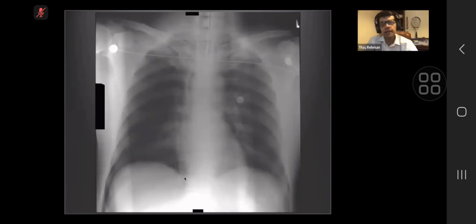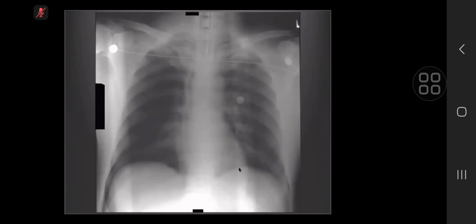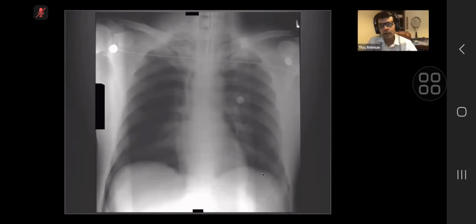So pneumothorax in supine projection, deep sulcus sign. There is another useful sign associated with the deep sulcus sign in supine pneumothorax, which is that the superior margin of the involved diaphragm will be quite pristine and sharp. Can you see that? Yes. It is outlined just by air and not by air inside the lung. Compared to the slightly fuzzy left hemidiaphragm, the right is quite sharp and clear. So deep sulcus sign and a sharp margin of the dome of the diaphragm on the same side.